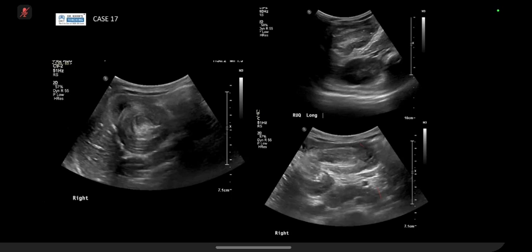Yeah, sure. These are the selected images of the ultrasound of an abdomen. I can see on the left side there's a target sign, which is comprised of the bowel, and on the right, upper and lower, I think this indicates a pseudo kidney sign. So these are most likely to represent intussusception. Yeah, correct. And then we'll move on.